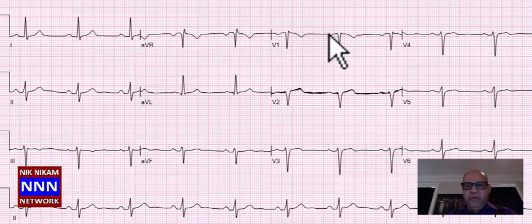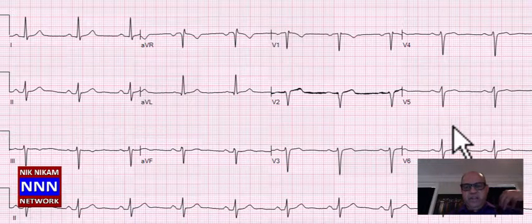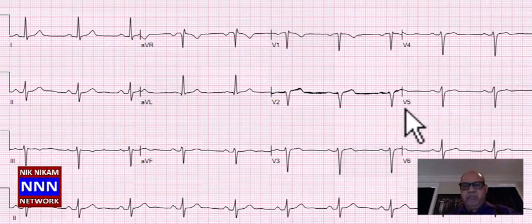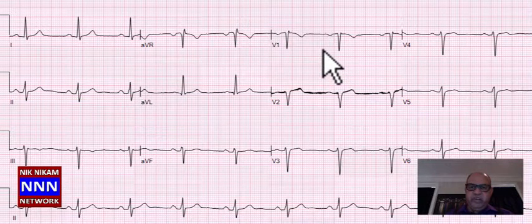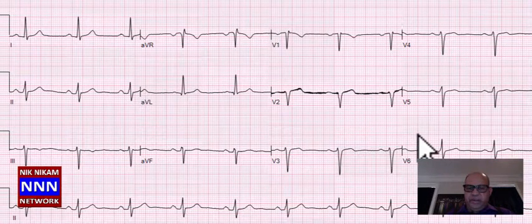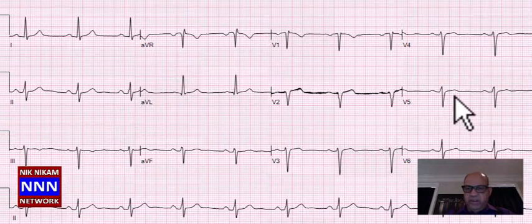Like in this case, why is this patient having loss of R waves almost anterolaterally? This could be if you place the leads in a high up position, then all the electrical activity is moving away from the electrode. As a result, you're going to get a QS complex. Maybe repeat this electrocardiogram by putting the leads at least 1 or 2 spaces below the nipple or the fifth intercostal space, and see if you can get better R wave progression. If the patient has chronic obstructive pulmonary disease because of emphysema, there may be a lack of R wave progression in the anterior leads. Also, the T waves are okay, but the ST segment is slightly abnormal.